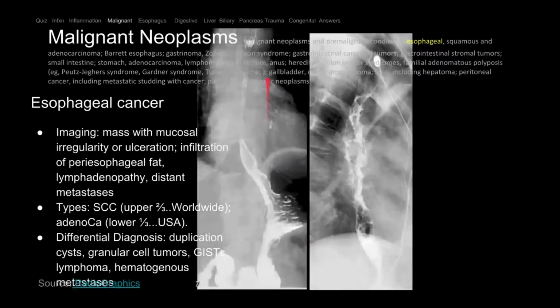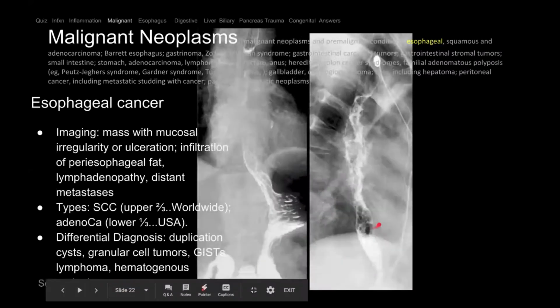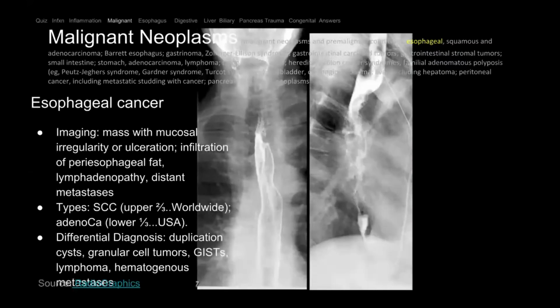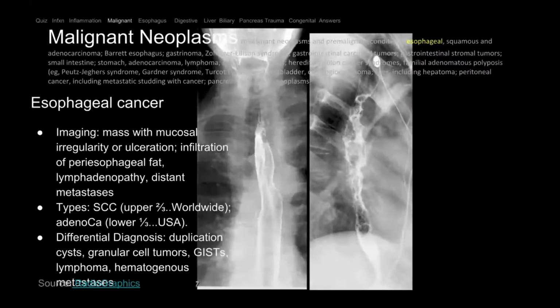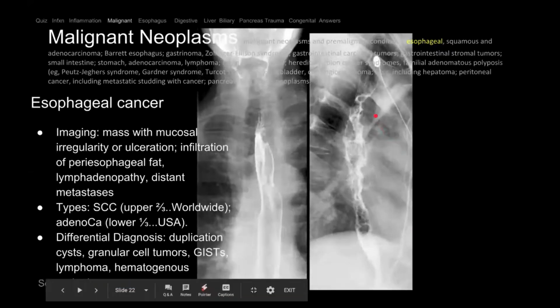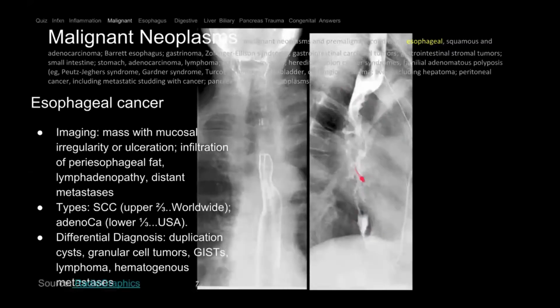So this is a normal esophagram. This is, what do you think about this? Is this normal looking? What's abnormal about it? What do you think? Let the patient go, nothing to do, don't worry about it. Slow movement of fluid. Good. Yeah, it's slow. And what else do you notice about the wall? There's these webs, right? There's like filling defects. We call them filling defects.